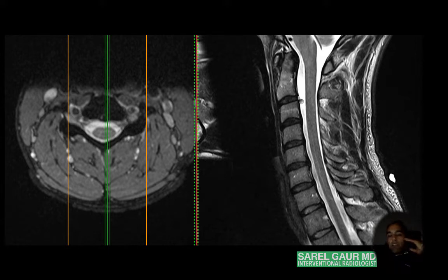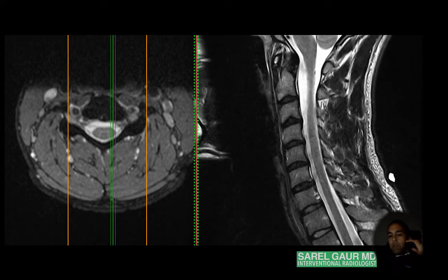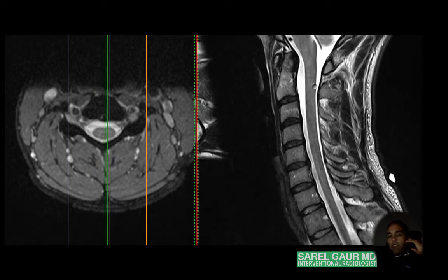But when you go into private practice, hospital-based practice, or community practice, you're really going to see a lot of degenerative disc disease. So it sort of changes your outlook on how you look at these. But regardless, you want to start, again, by thinking about the cord, thinking about the column.